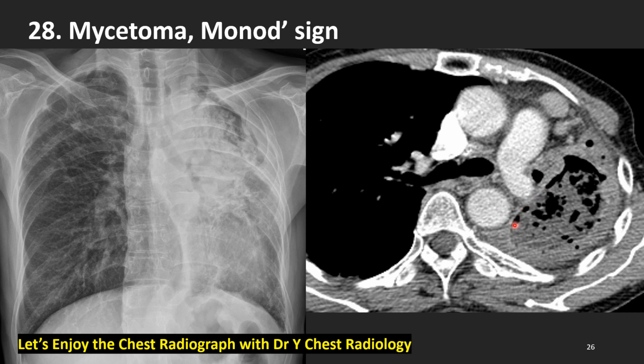We sometimes mistakenly use the term air crescent sign. That is not correct for here. That is for angioinvasive aspergillosis.